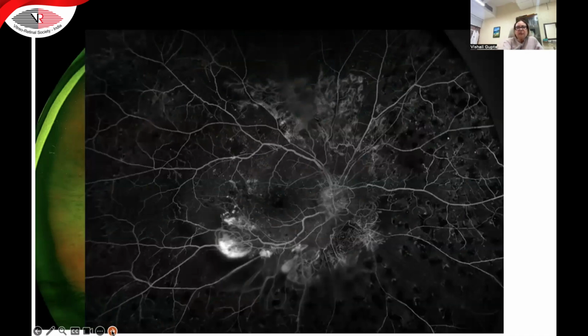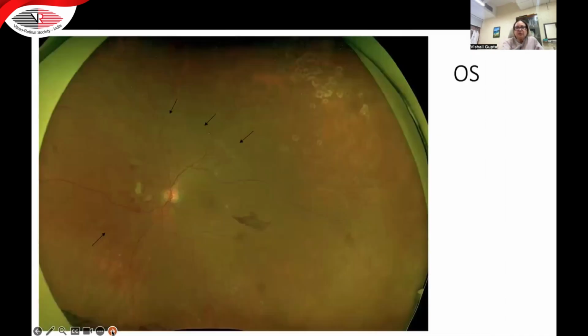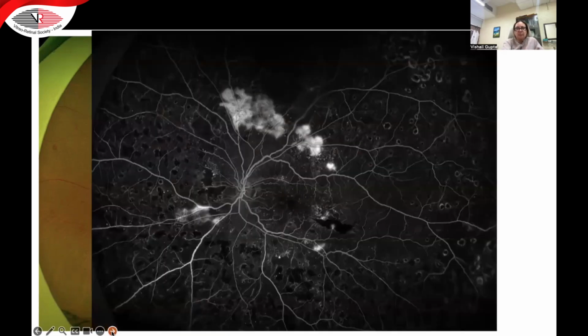If you see angiography, it's more clear, because these new vessels leak and you can identify them. Many times they may be quite subtle, and you may have to do a good clinical examination to look. But if you see a preretinal bleed, you must look, because there have to be new vessels somewhere, and that will give you a reason to do PRP. Again, if you're not very sure, do a fluorescein angiogram, and these vessels will show you very nice areas of leakage.